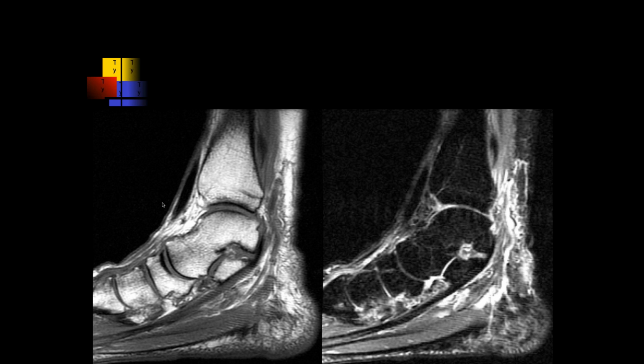Okay, so on this image, we have some sagittal images of the ankle, and I don't see that normal longitudinal arch, so I'm concerned that this could be pes planus. Okay. So then we also see a retracted tendon up at the level of the distal tibia. Okay, so that's the retracted PTT. Right. So this was a complete tear, which was chronic, and this patient has adult acquired flat foot deformity due to posterior tibialis chronic tendinopathy or lack of function.